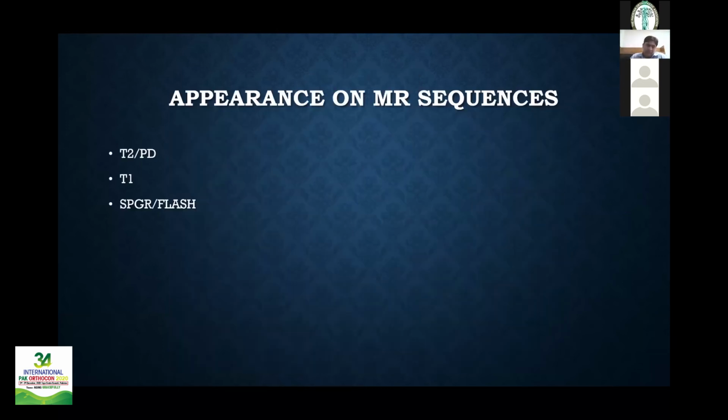As I talked about before, the cartilage has a different appearance on different sequences, and the usual sequences used for mapping of the cartilage are the T2 and PD weighted images, the T1 weighted image, and the SPGR flash image. So let me show you an interactive case in which we look at the appearance of the cartilage on these sequences and the pathologies.